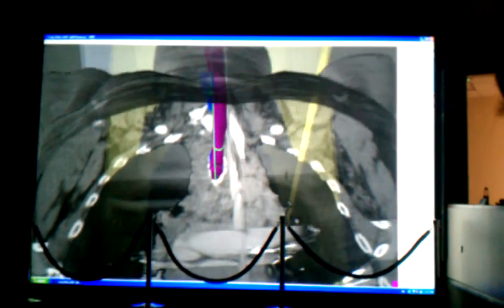You can kind of see where we are in the patient and what it looks like, where our lungs are and things like that. I can also turn on all the different structures here for the patient, where their left lung is in relation to the right lung, in relation to where this particular patient's tumor is. And these are all real patients that are loaded into the system, and you can see this big tumor kind of wrapping around very critical structures and organs at risk.